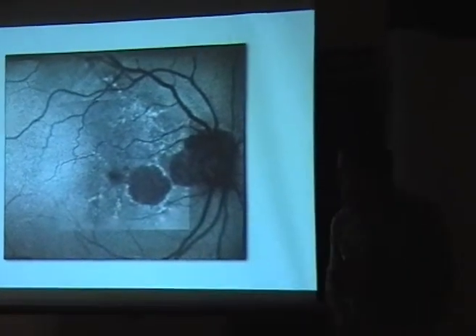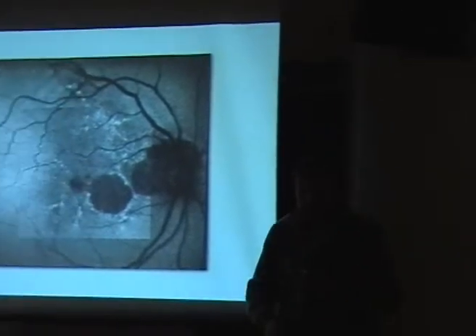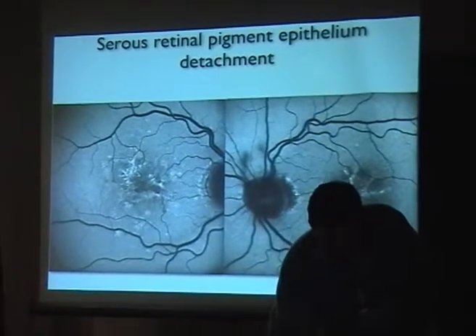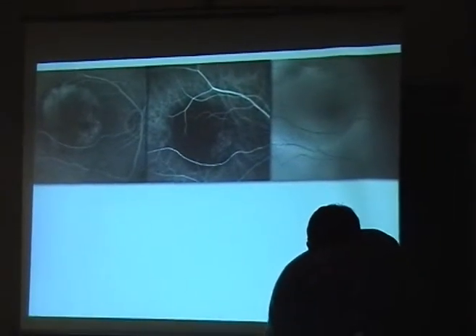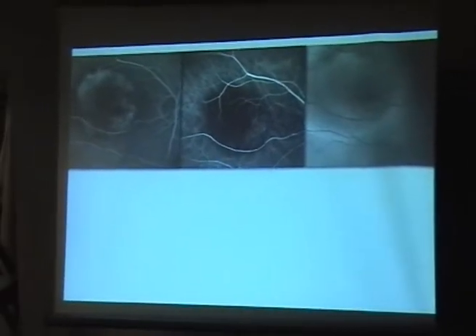Like, for example, here you see that was done in this way.